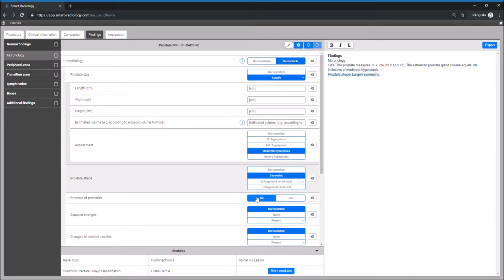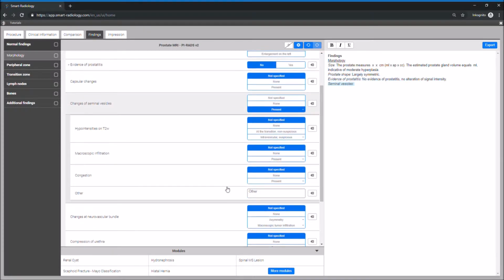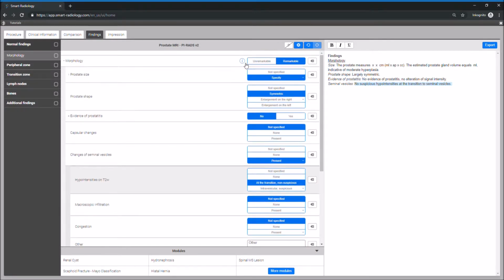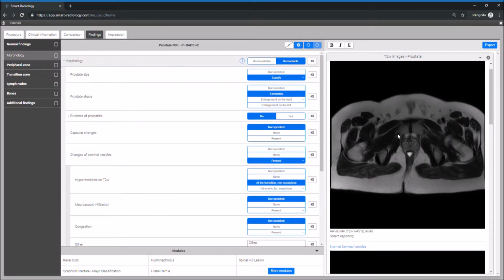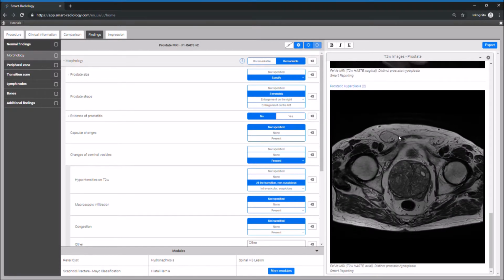Navigation elements are displayed in the dark grey navigation bar on the left. One or more navigation elements are part of a top-level element. In turn, one navigation element consists of multiple decision tree elements. You can find the decision elements here. Furthermore, we have a number of info boxes for you to refer to for additional information.